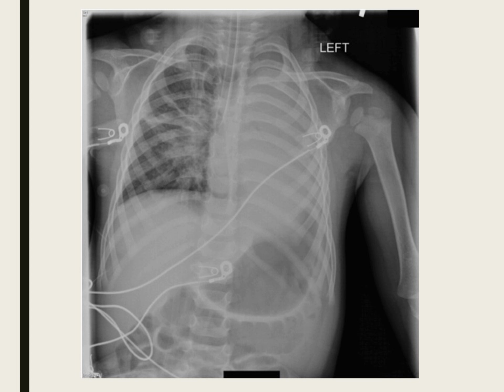Is the ET too far down on the right side? Perfect, thank you, exactly. So this is right mainstem intubation. The tube is in the right lung, it's not ventilating the left lung, not getting any air, so it collapses partially, right? Things get sucked into the collapsed area, you're only ventilating this side. So what we need to do is pull the tube back and get another X-ray.